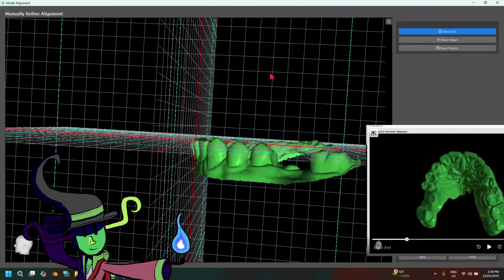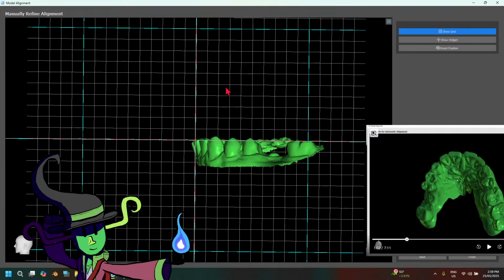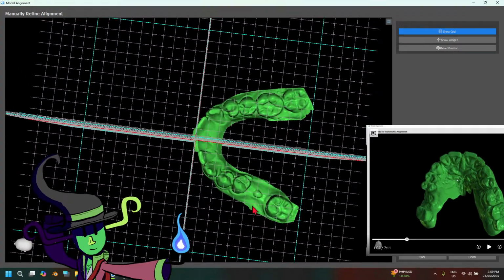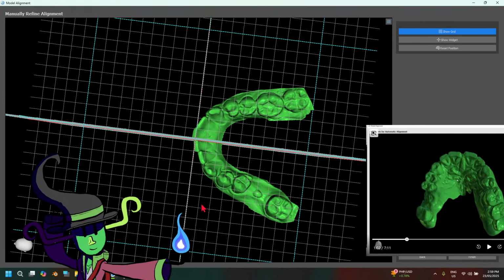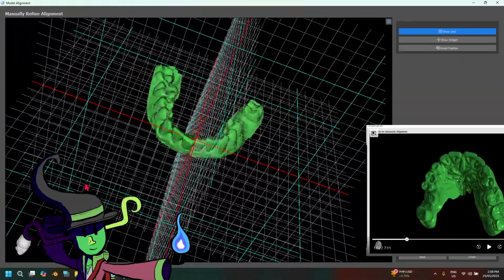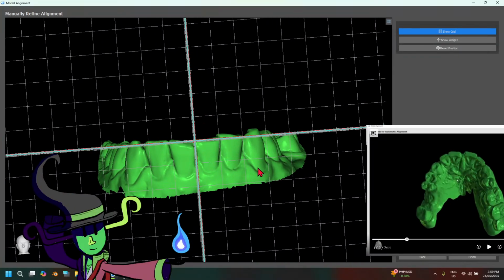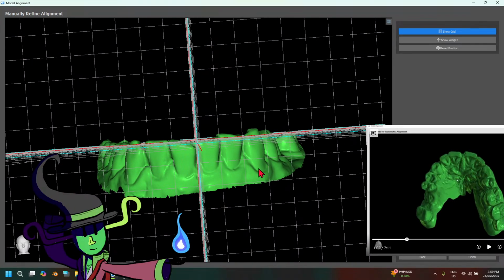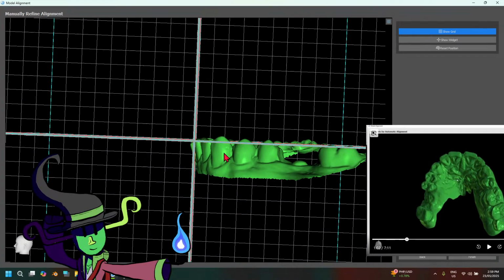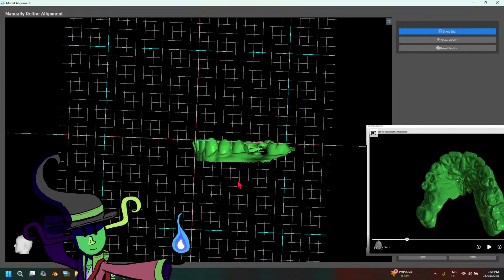It will just snap your viewpoint to one specific angle. But in Blue Sky, you have to align it manually, I'd say. And I think that's a bit frustrating. There are certain cases you just want to look at the XZ view of your 3D model, or maybe look at it from the YZ perspective here, without having it look crooked.